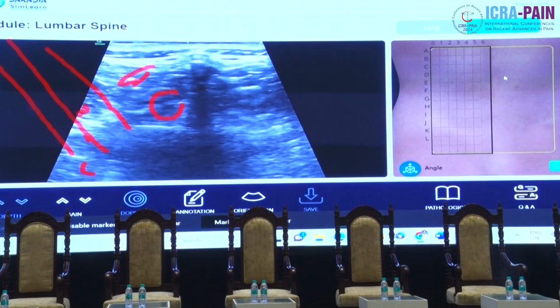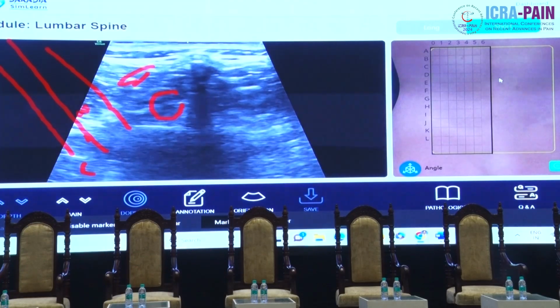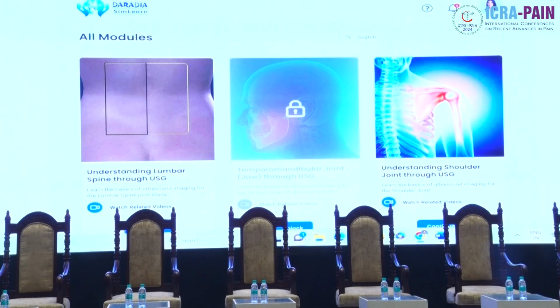Okay, so let me stop here. Some more features are coming, and I'll be asking Nandini. She and her team are basically helping us to develop this software. So the majority, 80% of the job is done, still 20% is left. And she'll be showing you some other features.